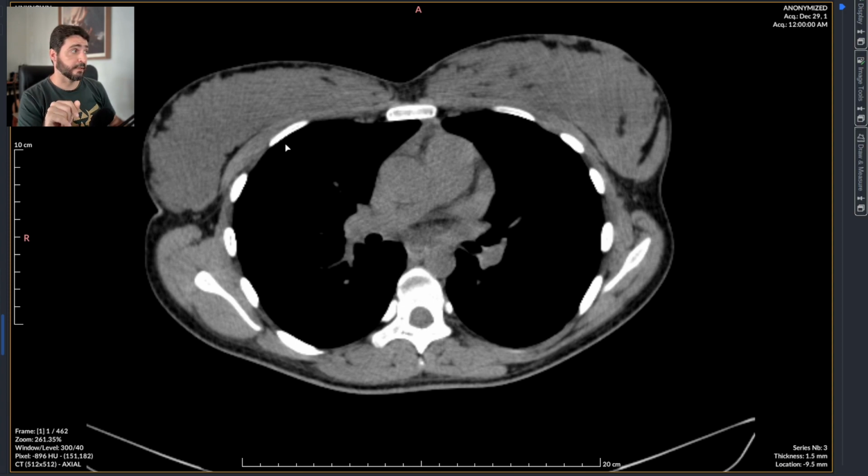If it's your first time here, just a quick recap. This is a CT scan, a computed tomography scan. Computed tomography is a modality of axial imaging, so these are cross-sectional, axial, transverse images. The patient is lying flat on her back on the scanner table. She goes head first into the scanner, and you have to picture yourself sitting by the soles of her feet looking forward. So this is anterior, this is posterior, this is left, and this is right.